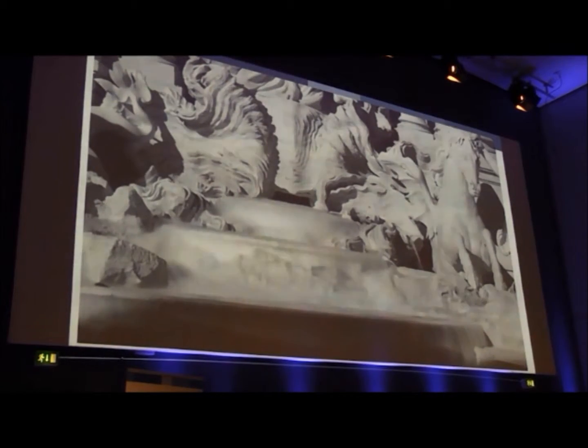And the way you do that is you take a film, then you copy the film, and you subtract one frame from the film, and then you subtract the first film from the second film. And everything that remains still, like the horses and the fountain itself, will be subtracted out of the image, and everything that is moving will not be subtracted out of the image. So what does this mean?